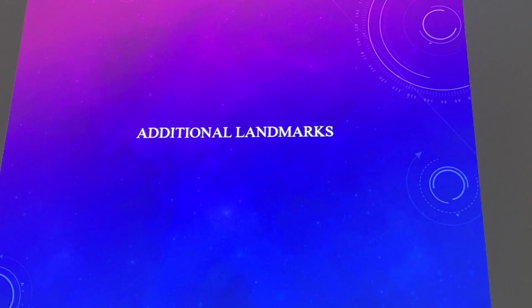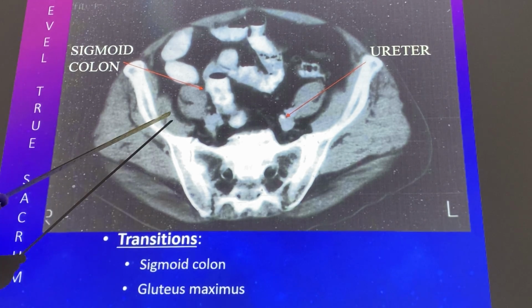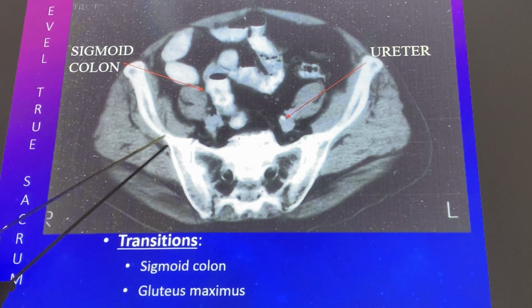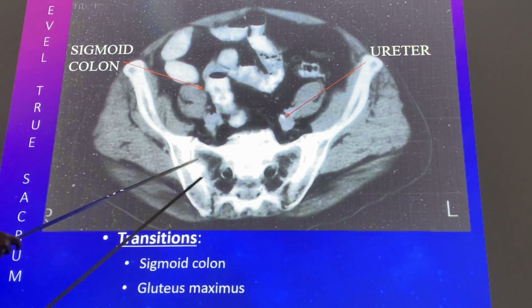A couple things I want to cover right now, and then we'll begin. This will give me an opportunity on Thursday to go through contiguous slices. Just a couple more things I want to cover with you, if I may. Iliacus is right here. Psoas muscles is right here. Gluteus minimus, medius, maximus on the side over here.